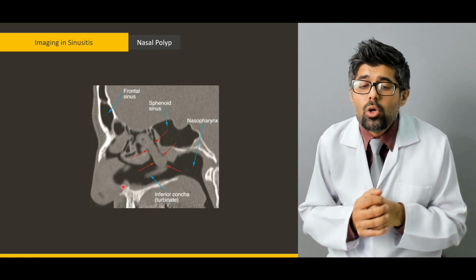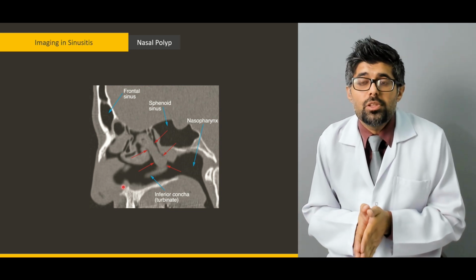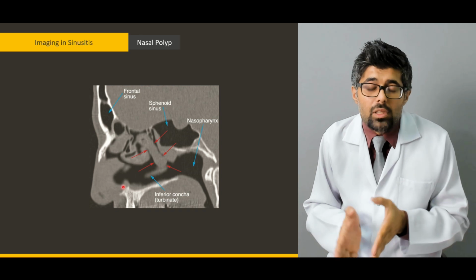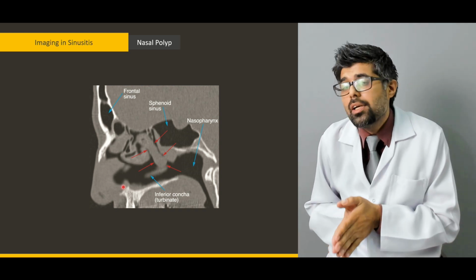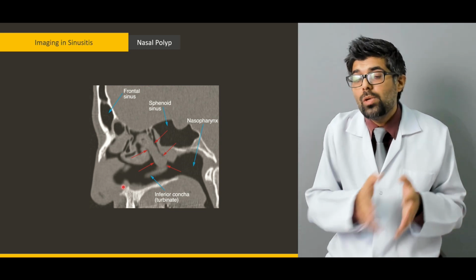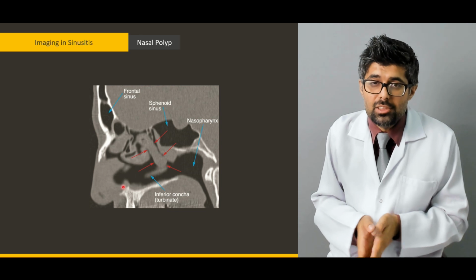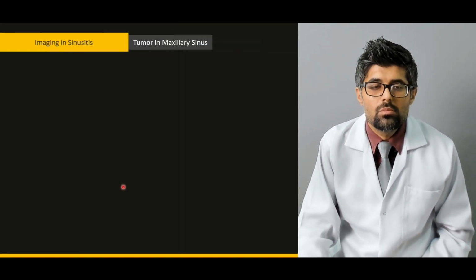So the nasal polyps are diagnosed with a physical exam, but for the severity or grading of it, and to find out how the treatment is going, we can perform CT scans.